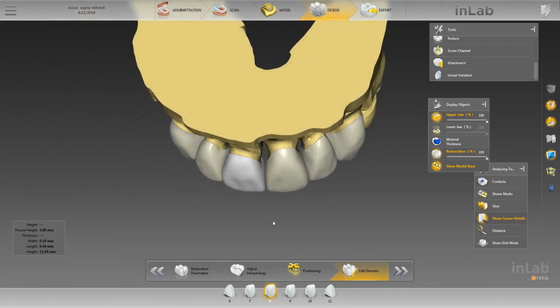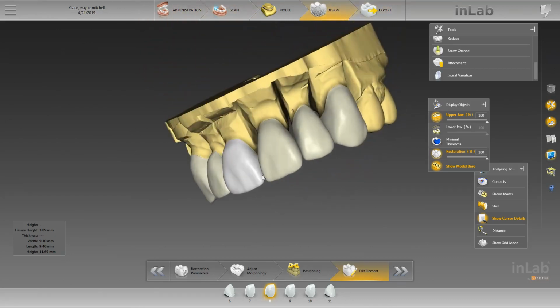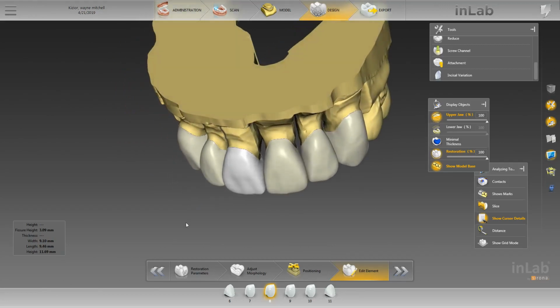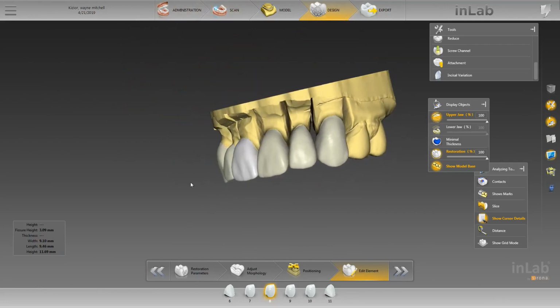And our goal here was to go for a natural appearance, or in other words, as I mentioned before, or as you're about to see, we're trying to make perfect imperfections, and that's just a great way to summarize making a case look natural. This isn't perfect, and this wasn't an easy case to design, but that's kind of why I want to showcase it for you guys.